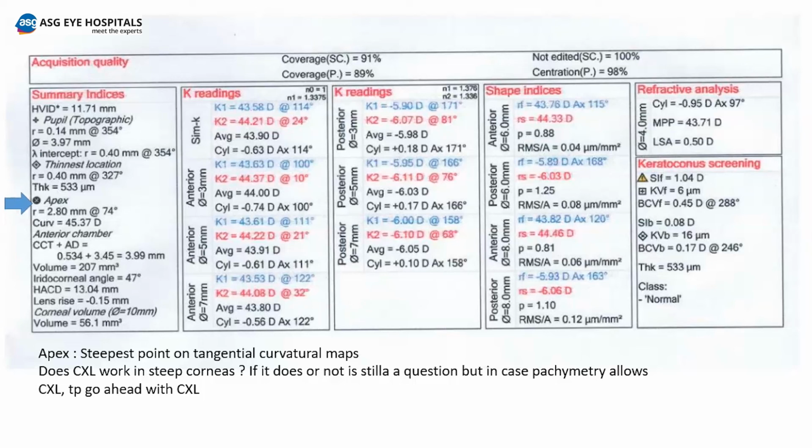So we don't stick to any arbitrary cutoff also in those points. I hope that helped. Anything else? Because it's difficult to read with so much clutter, these are the 5-6 important parameters of Pentacam, and we use the same parameters with different standard values in Sirius, so that we are able to see and compare a Pentacam map and a Sirius map of a patient in a similar time period.